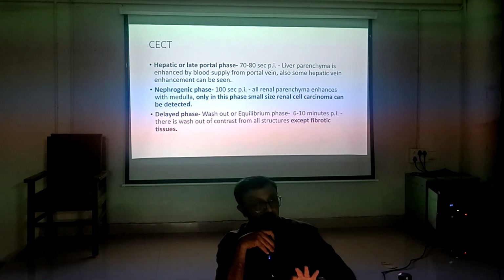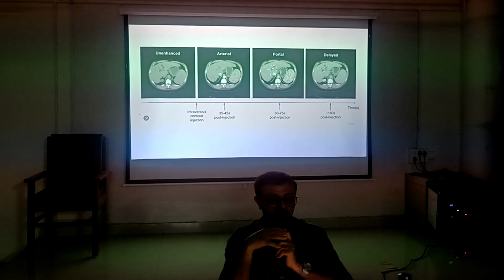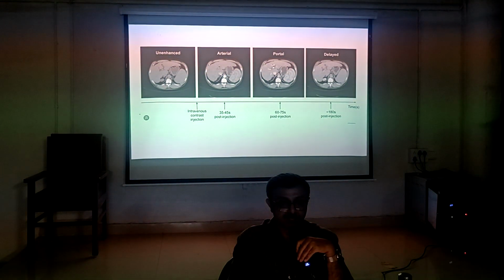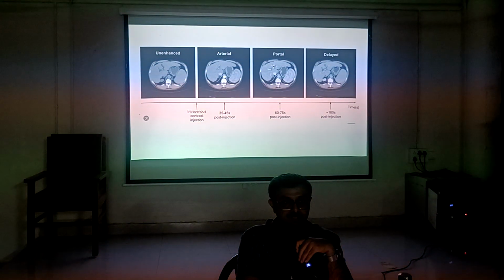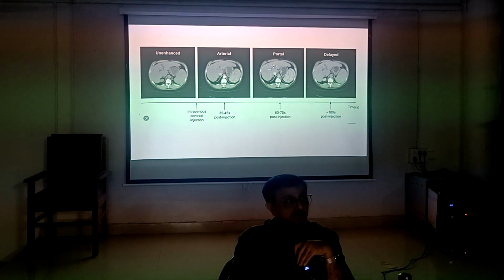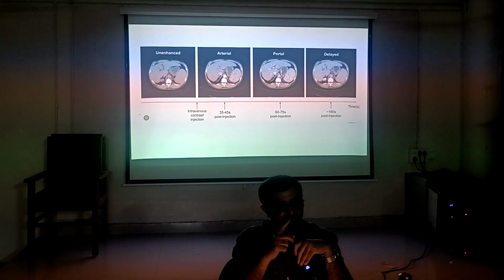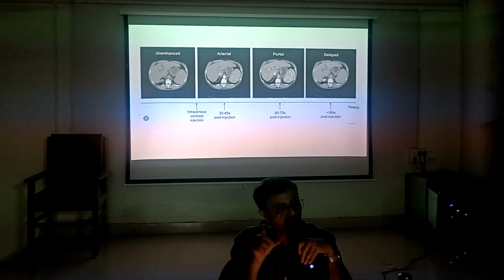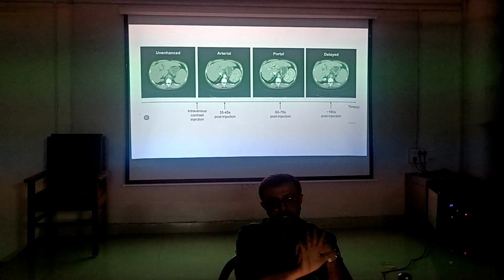How can we interpret the image? You can see here in the image: there is a second arterial phase, there is a portal phase. Lesion in the liver. So first phase isodense, second phase vessels are opaque. So a vascular tumor will be opacified, then the tumor parenchyma will be opacified. Delayed phase, washout phase. So how can we see the tumor?